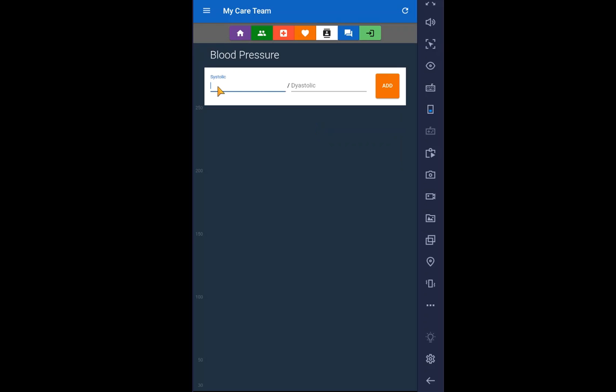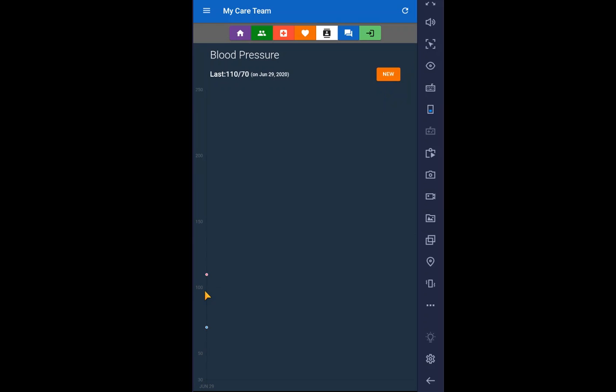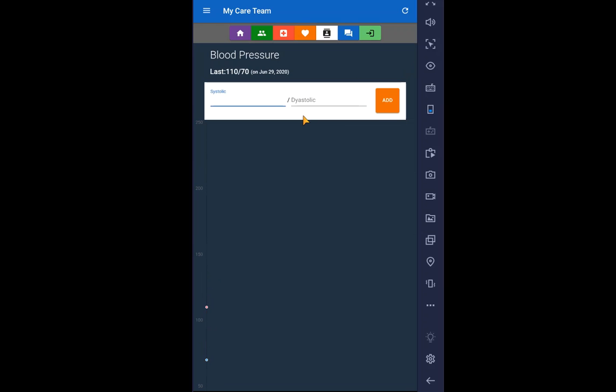We've got a blood pressure here. We're going to say we'll do a nice blood pressure here of 110/70. So now we have that blood pressure recorded. There's the first reading, the 110, the 70. We'll do another blood pressure here. We'll put them a little lower, we'll go 80/50.